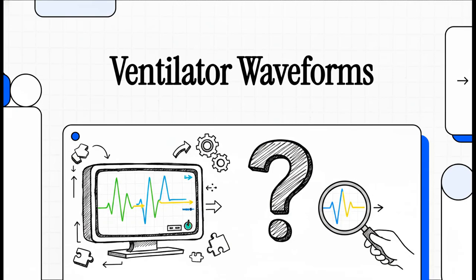You know, if you've ever stood at the foot of an ICU bed, you absolutely know the feeling. The rapid, rhythmic beeping of the mechanical ventilator. It can be incredibly intimidating. You're staring at this monitor filled with jagged green, yellow, and blue lines, and you just know the machine is trying to tell you something absolutely critical, but it's like it's speaking a totally foreign language.